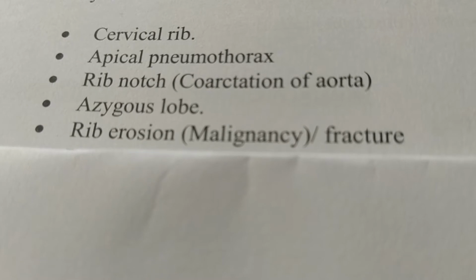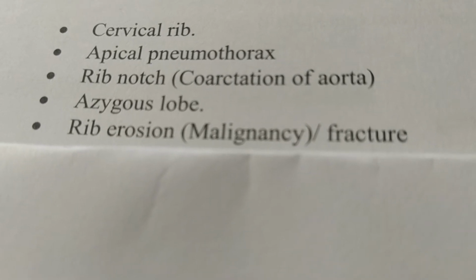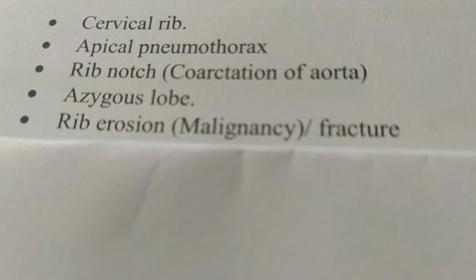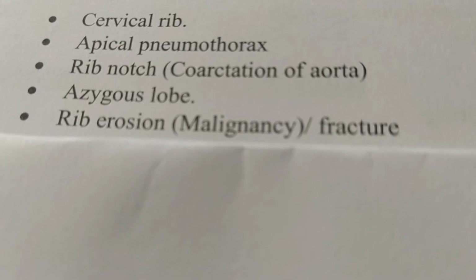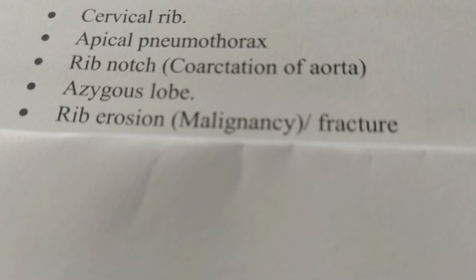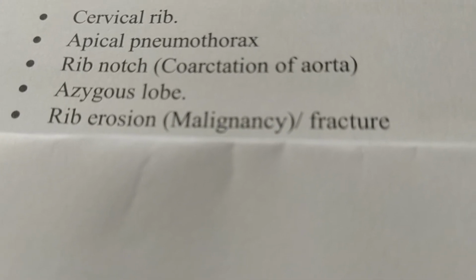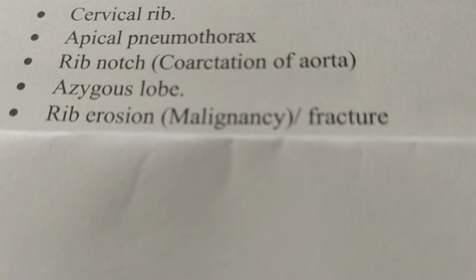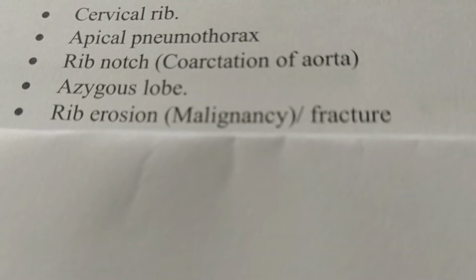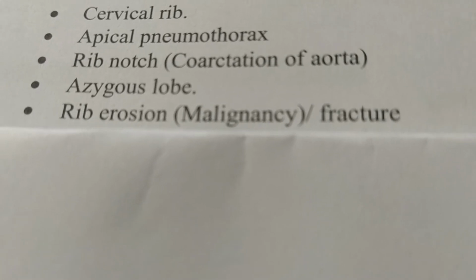Next, rib erosion. Rib erosion is due to malignancy. It may be lung malignancy or breast malignancy or malignant deposit from another part of the body. There may be rib fracture, which is very difficult to appreciate on X-ray. Rib fracture.